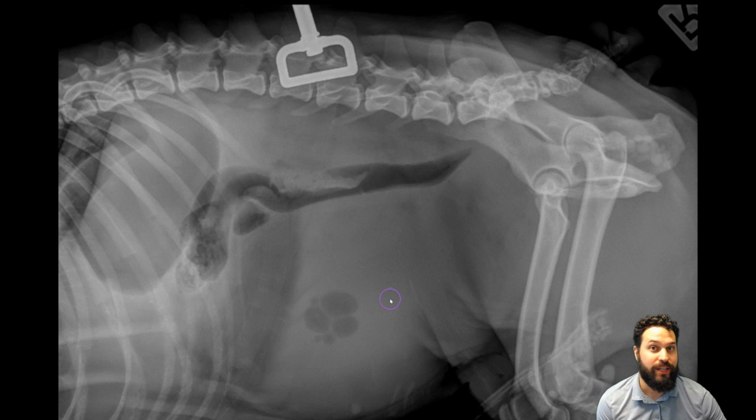In terms of radiolucent calculi, my guess would be that folks were looking at these gas bubbles centrally and asserting that potentially those were radiolucent calculi. And what's important to remember about calculi that are technically radiolucent is that we actually shouldn't see anything at all. Because the soft tissue in the bladder is more opaque than those typically radiolucent calculi, we're not going to see them at all.